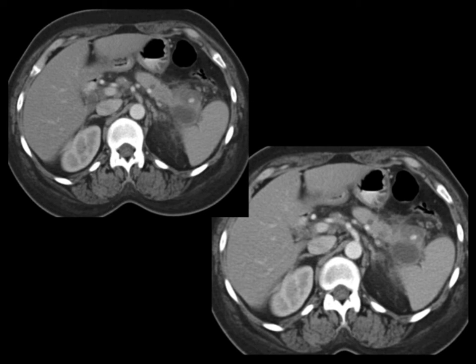The patients can bleed to death. Remember, we said aneurysms are often incidental findings. Pseudoaneurysms are often symptomatic, though not always. And you can see in this case the pseudoaneurysm. You also can see some of the hematoma around it, which is compressing it. These can easily rupture and the patients can exsanguinate. Very, very important life-saving diagnosis.